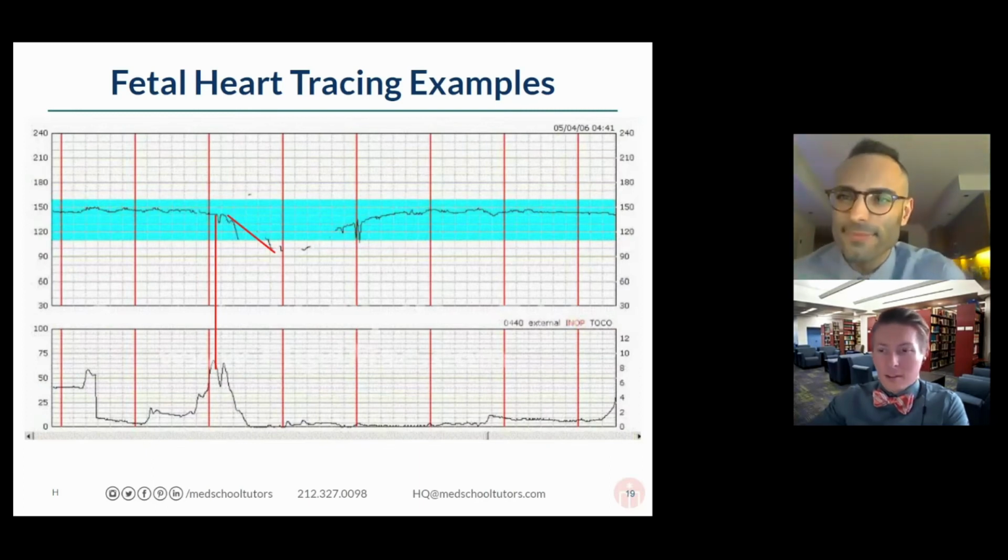No, you nailed it completely. Just want to keep in mind that the late decelerations is the scariest thing that we're going to look for. Now, I'm going to get a little bit more complicated and dive deeper than anything we talked about so far.